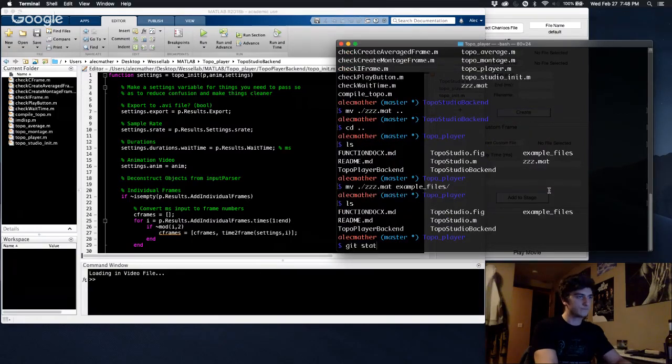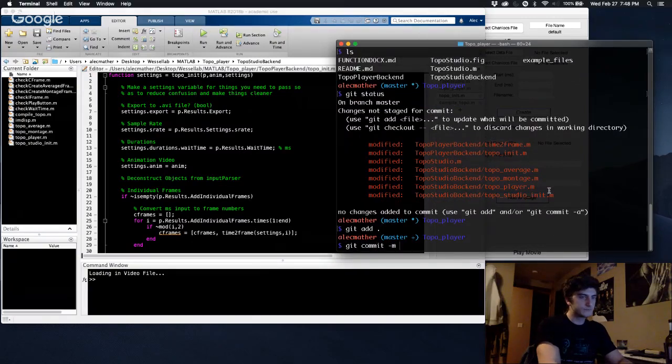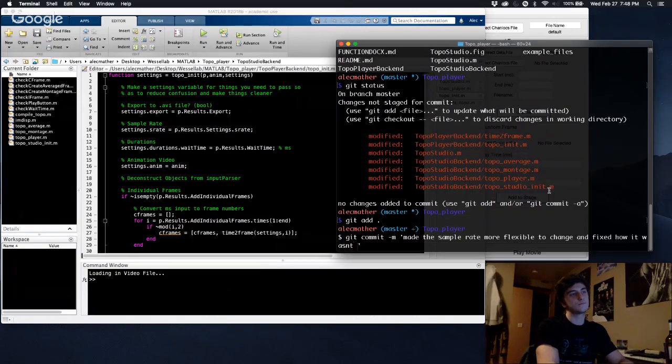Okay. That's all we need. We made it more flexible.